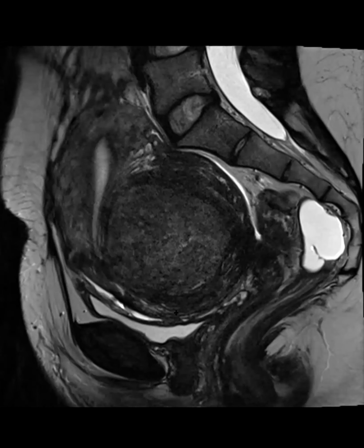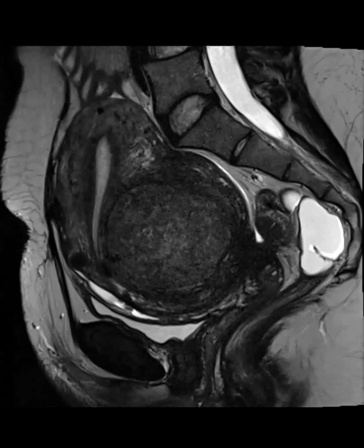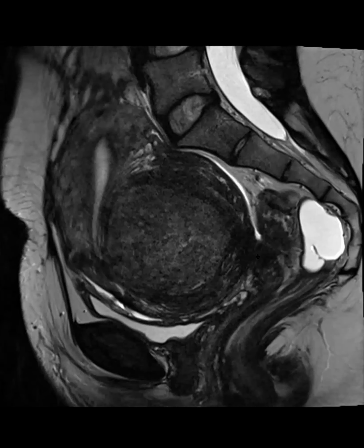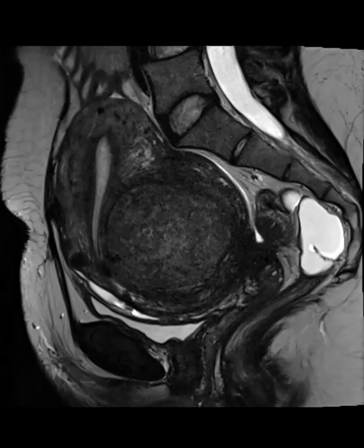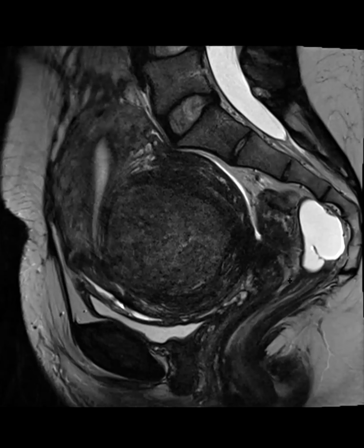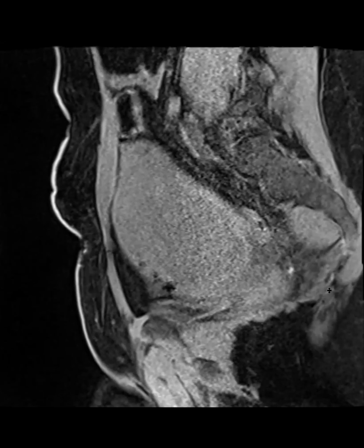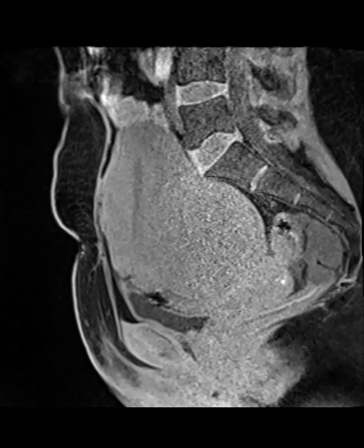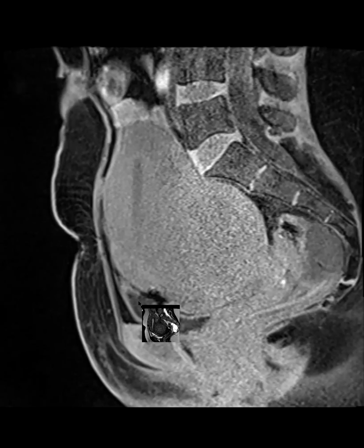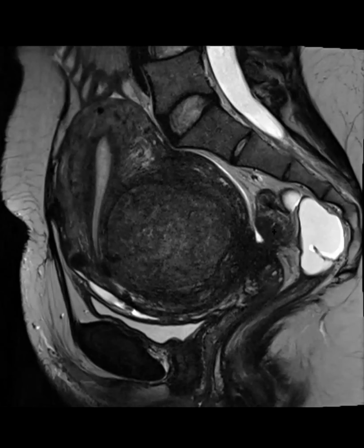And, you know, I feel like until you see it over and over again, it's kind of hard to pick them up, especially if they're small. So this is an example of DIE, deep infiltrating endometriosis. Here it is, this T2 dark, and they don't have to be T1 bright, and this one wasn't. Here it is. She does have endometrial implants elsewhere, but in that area of scarring right here, it's T2 dark. And in this case, it's adherent to the anterior rectal wall.